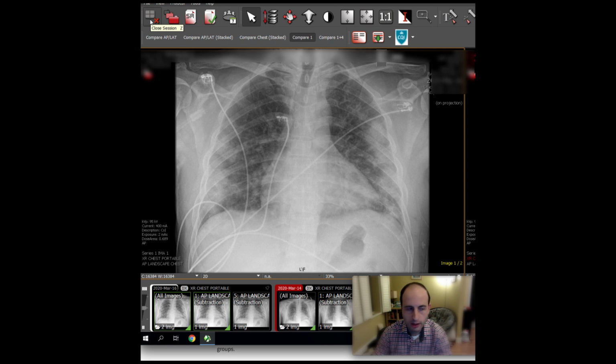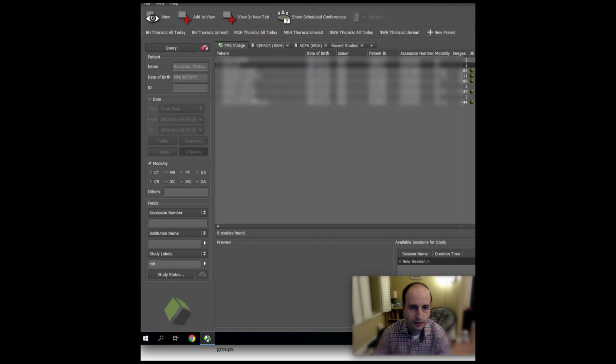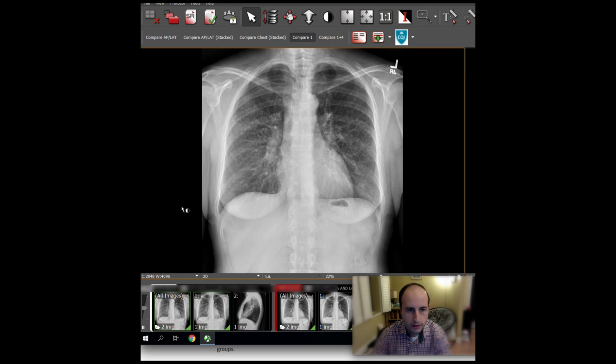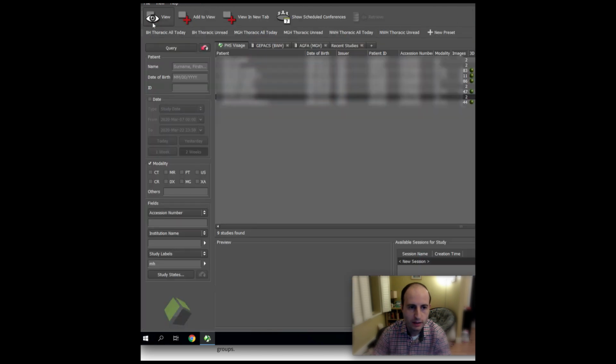So you can see obviously these chest X-ray findings are not specific, and just as a fun mimic here, I'm going to show you this case. This patient also presented with fever and dyspnea, and you can see here somewhat more central perihilar interstitial opacities with a subtle nodular character, and you can see some hilar enlargement as well. And this patient actually has sarcoidosis. So obviously there's a very large differential diagnosis for the chest radiographic appearance, but you should get a sense of what you're kind of expecting to see.